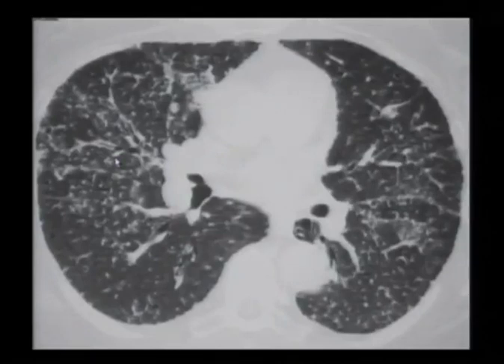That's probably the leading differential diagnosis for a perilymphatic nodule in the proper clinical setting. The other disease I mentioned in one of my talks earlier is lymphangitic spread of carcinoma. This is neither of those. It's going to be one of those weird ones. Help round out your differential.